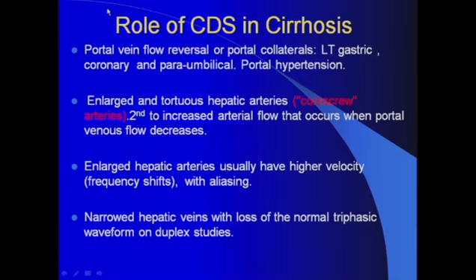Now that we talked about the grayscale findings in cirrhosis and chronic liver disease, we move on to address one of the most important aspects of evaluating patients with cirrhosis, which is the role of color Doppler sonography in this population of patients.